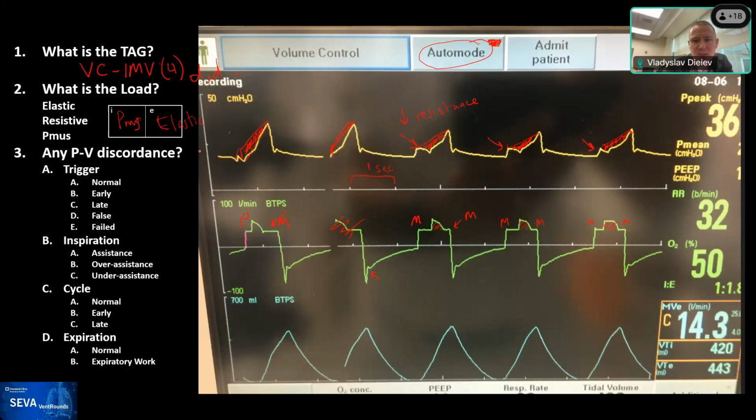Okay, excellent. And then there's another thing that we can highlight here during the expiratory waveform, that the patient muscular effort actually continues probably a little bit beyond the breath. Will you agree, Eduardo, that we see a little bit of muscular effort here going beyond the cycle? This is important. You refer to these little notches?